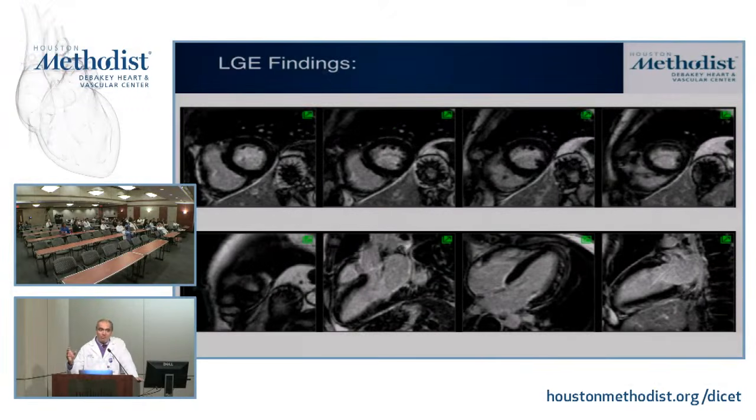And again, remember, if there's myocardial infarct, the pattern is going to be subendocardial based. If it's a non-coronary pattern of injury, then you have to think about something else. So what do you see here? Maybe the arrows might help. Make it easy. You got multiple little patchy foci of enhancement in the lateral wall. This is classically what you would expect to see with myocarditis.